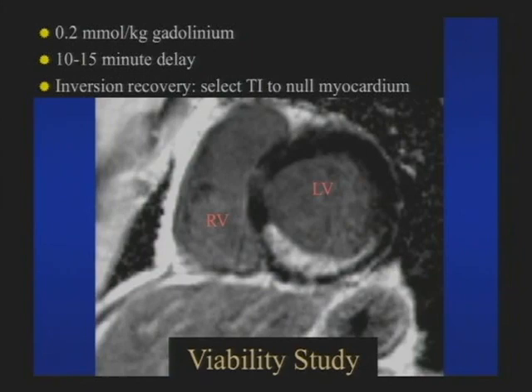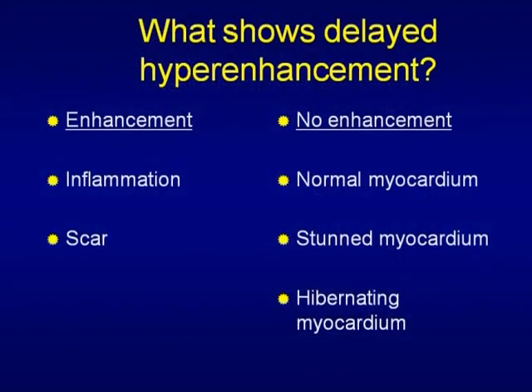Myocardium that enhances is abnormal. That's all abnormal myocardium, okay? There's a couple things that show enhancement. One is inflammation, like myocarditis. The other is scar. And in scar, we're thinking about myocardial infarctions.